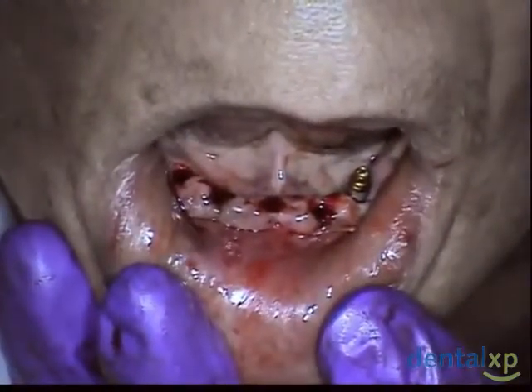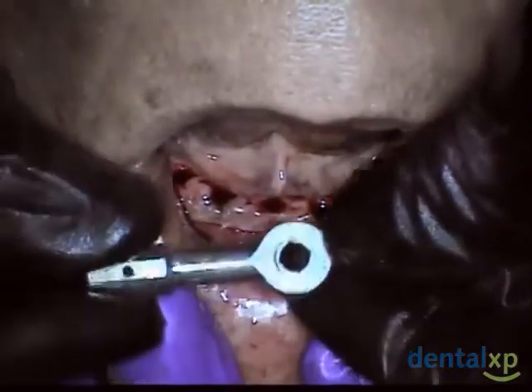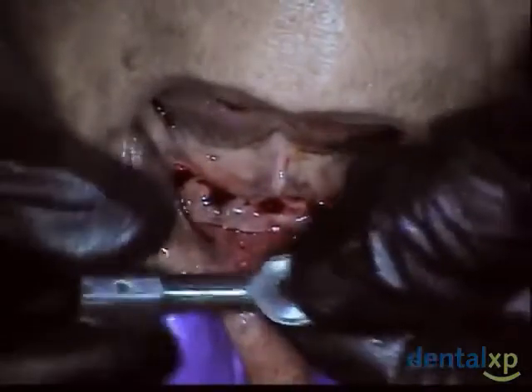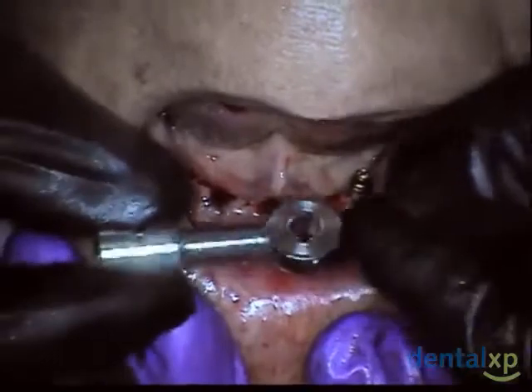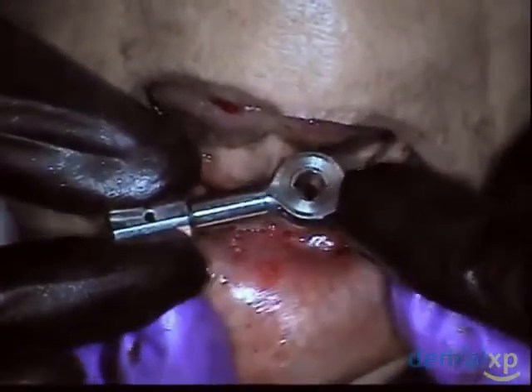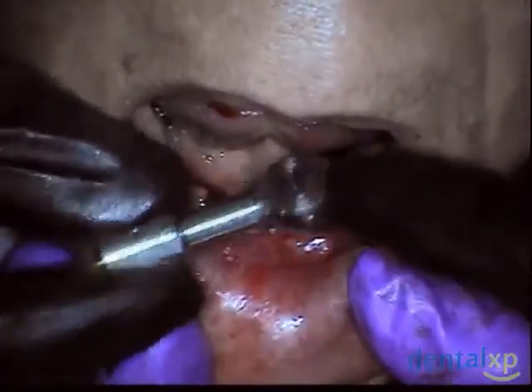So those people of wisdom at Stern Gold came up with a shorter one, so that if you're Hercules, you're going to create a lot of force. With a shorter arm, it's with finger pressure, and it's very doubtful you'll get close to that 40 Newton centimeters with just your finger. So this is the one that you want, not the other one.